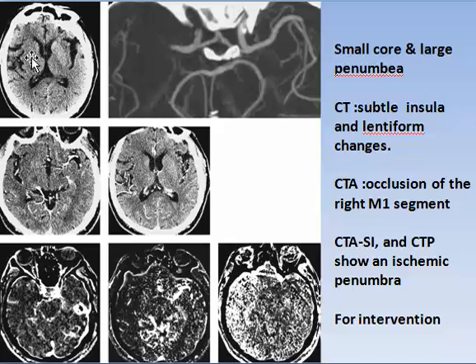That means vanishing basal ganglia sign, and the ribbon is attenuated, and the sylvian fissure is attenuated. That means the ribbon is swollen. So a swollen ribbon with vanishing basal ganglia sign, you cannot differentiate, and extends into the frontal region. This is the region affected.